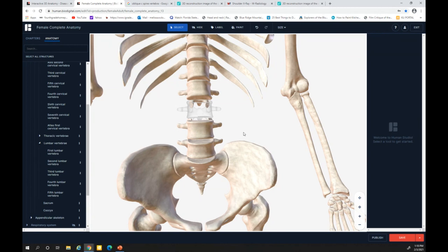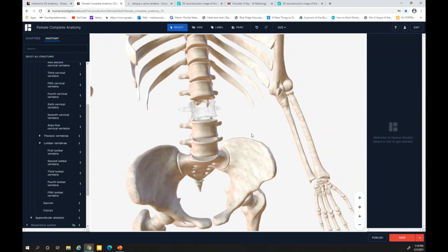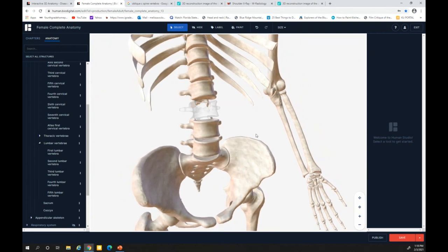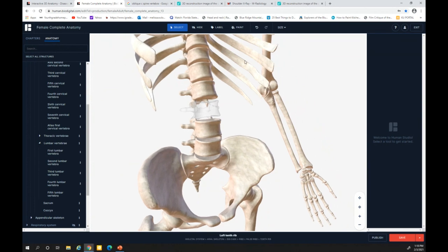So I'm going to rotate him into an LPO, that left arm going down, and then we know that an LPO elongates the left ilium. See how that left ilium gets elongated as this one rotates up. This area right here, this anterior part of the ilium, is that white line that you see in the images.